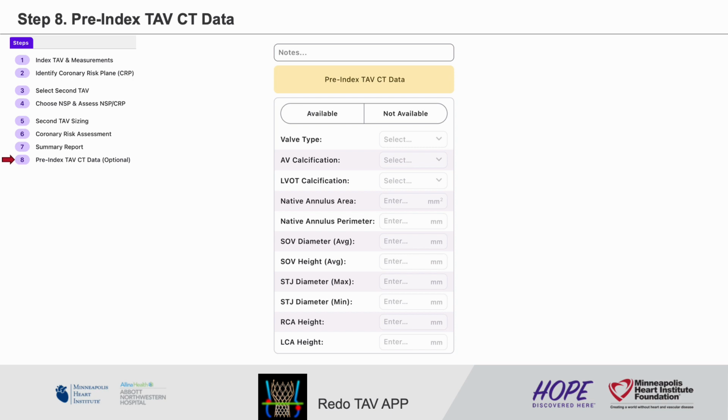This is all steps you need for pre-Redo TAV procedure planning. I hope this video helps your planning. Thank you.